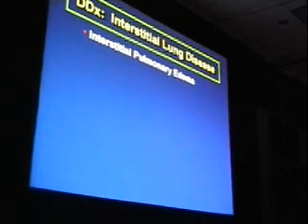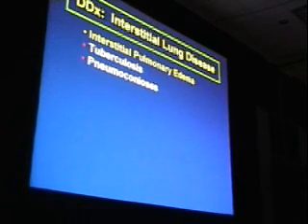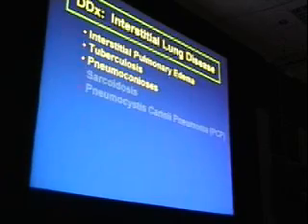First of all, if you see reticular, nodular, or small nodular disease, you always want to think about interstitial pulmonary edema. The reason for that is, one, it's very common, particularly in a hospitalized patient. Secondly, you don't want to be going through a huge workup for someone who actually has interstitial pulmonary edema. You want to keep in mind tuberculosis and the pneumoconiosis. Those two categories, again, frequently create a radiographic pattern that we refer to as interstitial lung disease.